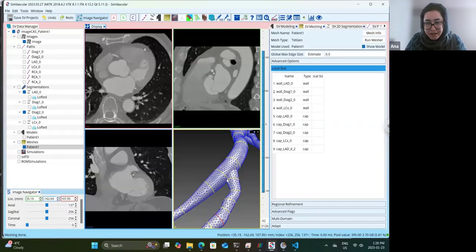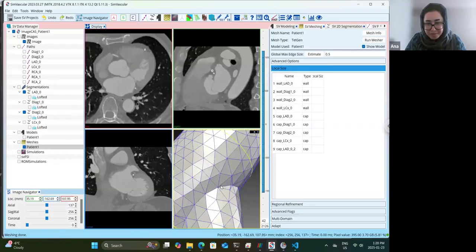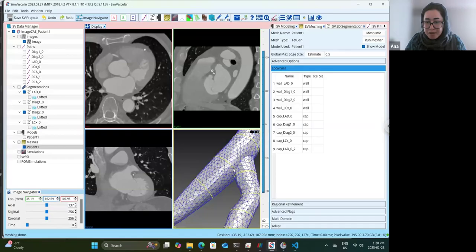And this kind of segmentation would make a problem in that case. It made a problem in the beginning for us. It gave us an error and we couldn't understand what that error was. We couldn't understand which one of the vessels is actually making the problem. So I went through a pipeline to better understand which one of the vessels is making the problem. And this time it ran, it worked.